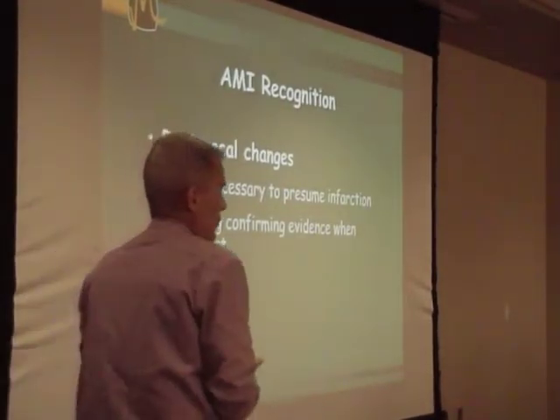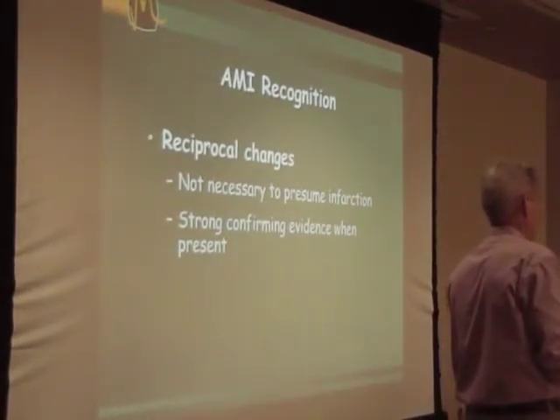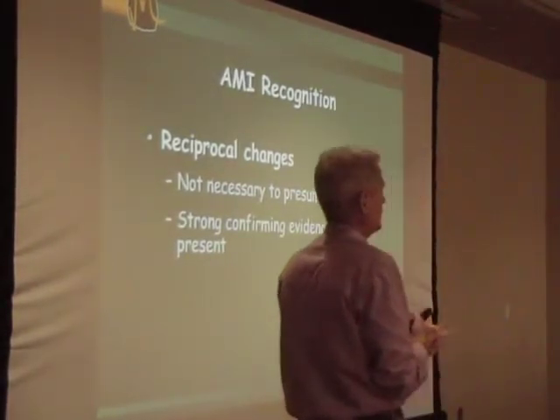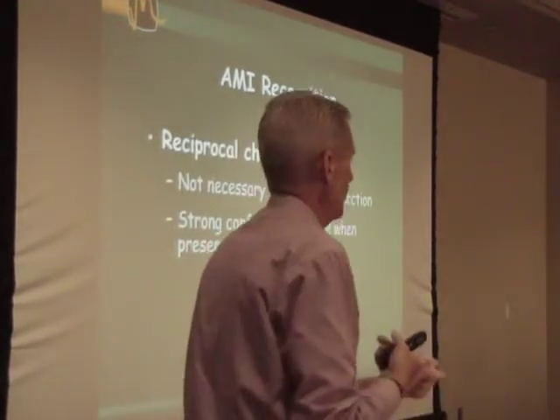So we talked about reciprocal change, what its importance is. It's not an exact science. Not every infarct will give you reciprocal change. Predominantly, they will.